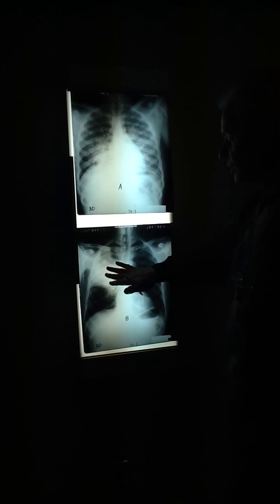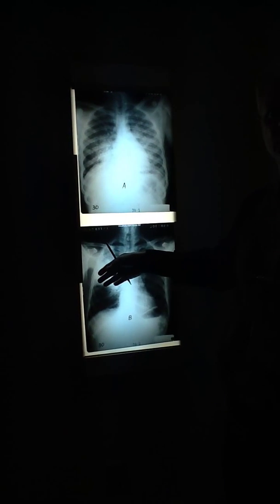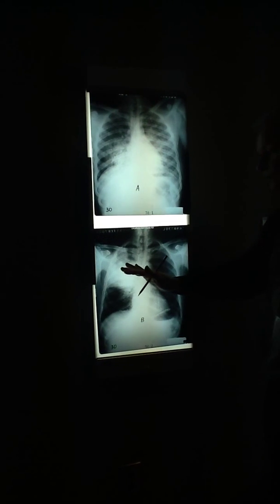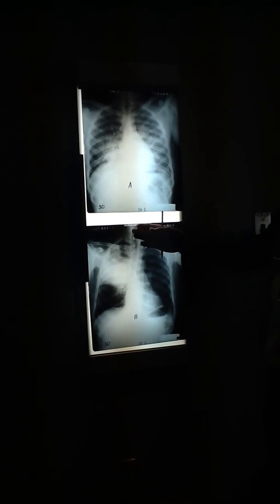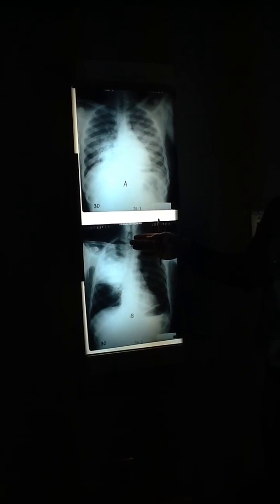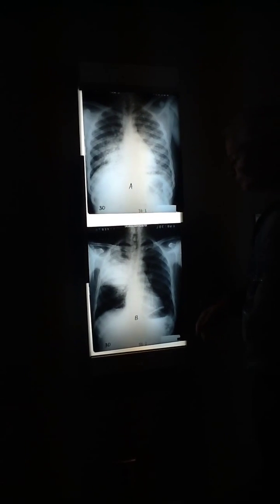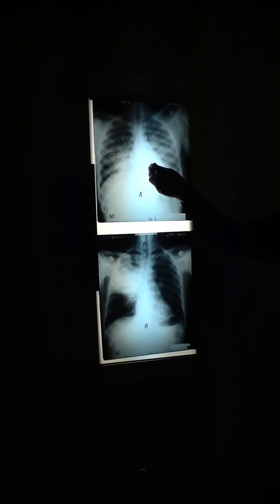This is a pneumonia, just a little bit earlier than those two, but the same problem. This is a right upper lobe pneumonia, just earlier than those two. Give this patient another 12, 24 hours, it'll probably fill up number 1. And that's mostly the result of pores of Cohn doing that, because the exudate just seeps through the peripheral air spaces. This up here is water, plasma fluid.